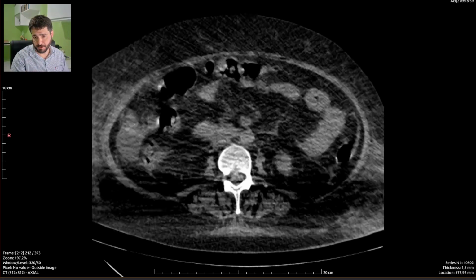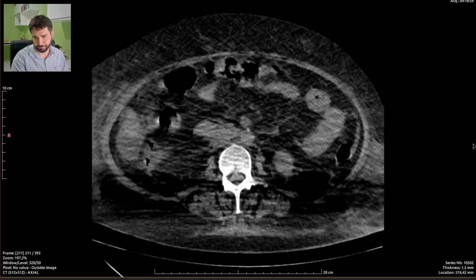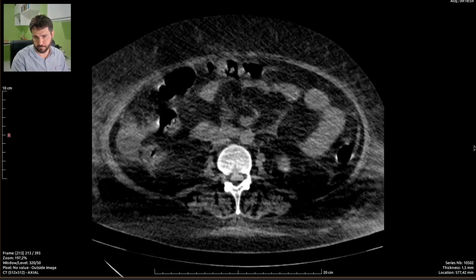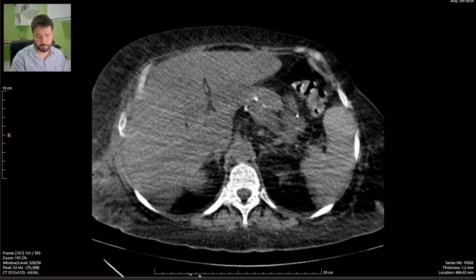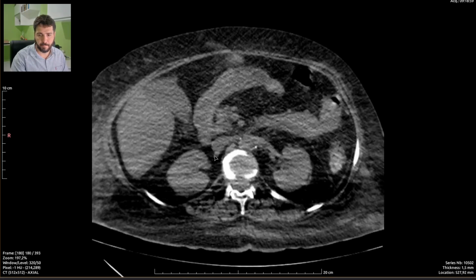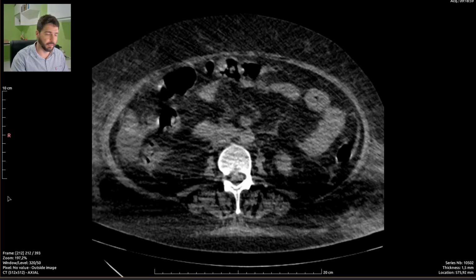Let me just check. Yep, a little bit of atherosclerosis, nothing major. No kidney stones.